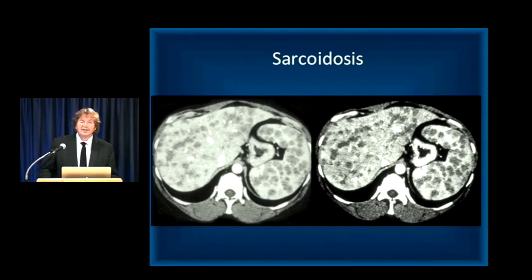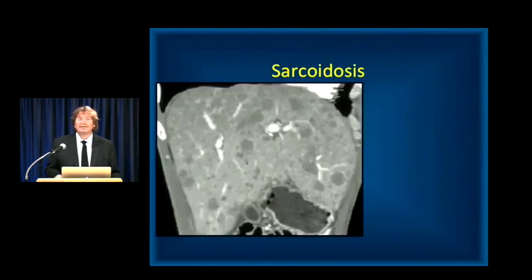Now, in this case, you can see both splenic and hepatic lesions, and the first thing you're thinking about, of course, is malignancy. You may be thinking about lymphoma, you might be thinking about metastatic melanoma. Well, sarcoidosis can involve both organs. The hint is if you had malignancy, you'd be very sick, with weight loss, fever. Here, patients have vague symptoms, have a CT for another reason, and voila, you see what looks like incredible disease, and you've got to be thinking sarcoidosis. Invariably, in most of the cases I've seen, there's no history of sarcoid.